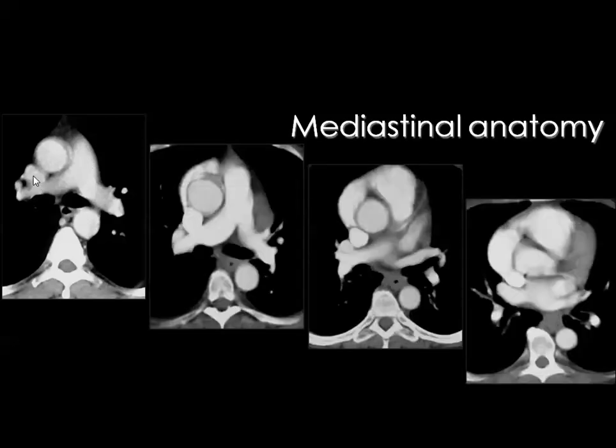Then this is the superior vena cava, and this is the start of the right atrium. And this is the superior vena cava has entered the right atrium. Then the pulmonary artery will enter the right ventricle. This is the pulmonary artery, and this is the pulmonary artery entering the right ventricle, which is adjacent to the right atrium.